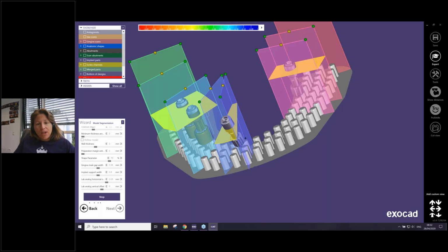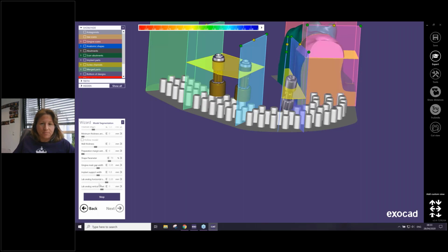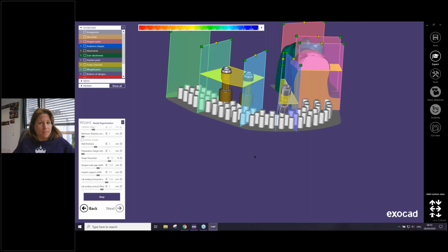Here, if you have different printers or maybe another analog system, then you can select your value for the gap of the analog. That's important to know. Here you can see this yellow region around, and if you like to change the gap value for the analogs, you have the possibility to do this over here. Okay, the calculation takes a little bit of time.